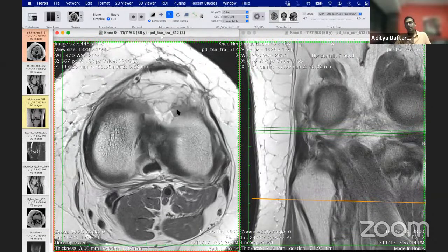The smaller structures, when you talk about the popliteofibular ligament and all the rest of those structures, are a little bit harder to see. You'll see them with time. But isolated injuries of those structures don't really explain posterolateral corner insufficiency. So the three things I look at most commonly are the conjoint tendon with the fibulocollateral ligament, the popliteus tendon, and the posterolateral capsule. Okay, now let's see what else we have here. I showed you the axial images on that. I'll try and show you some more structures. We're looking for discontinuity of those structures in the posterolateral corner.